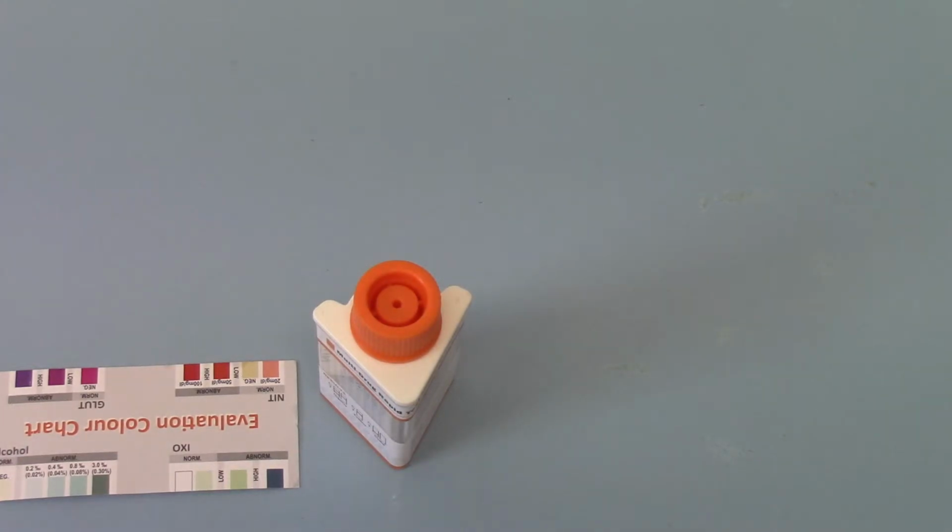result on these tests. So there you have it, the new DSD-8127-C demonstrated for you. These are going to come on catalogue probably towards the end of May, early June 2019, and they'll run alongside the existing 8127 and other barrel screens in our all test drugs saliva catalogue.